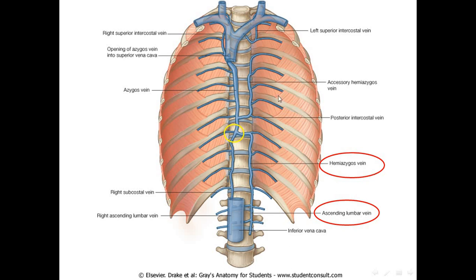So what we should know about the azygos venous system in the normal population is that it is this H-shaped structure. It passes alongside the two vertebral bodies, draining the thorax wall venous blood. There are a lot of variations, but we should know that the azygos vein is on the right and the hemiazygos and accessory are on the left.